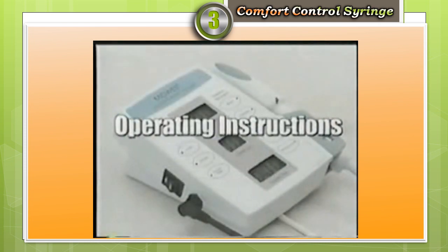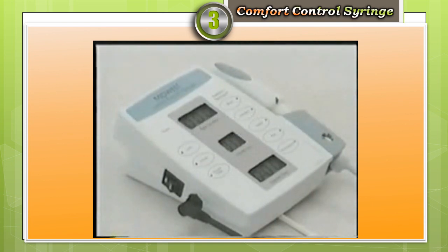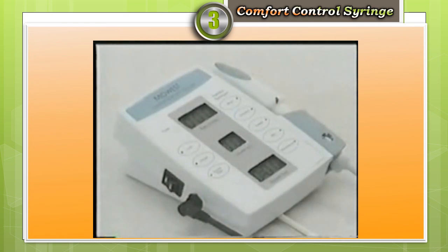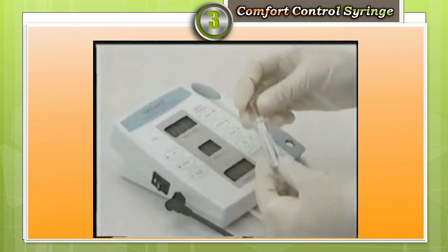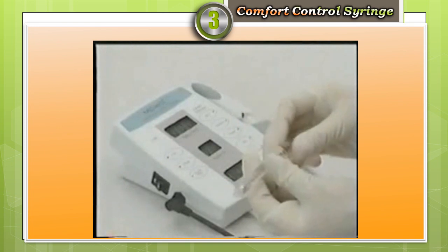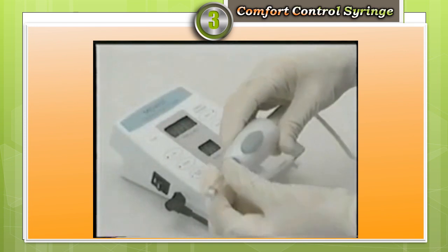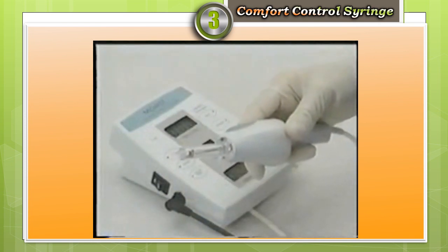Now that we have introduced you to the CCS controls, let's walk through the basic operations common to every injection technique. Begin by ensuring that the base unit has been turned on. If not, press the rocker switch to the on position. Load an anesthetic cartridge, metal tip end first, into a cartridge sheath. Insert the loaded plastic cartridge sheath onto the handpiece. Press firmly and twist clockwise 1/8 turn to lock in place. Be sure to fully engage the cartridge sheath in the handpiece.